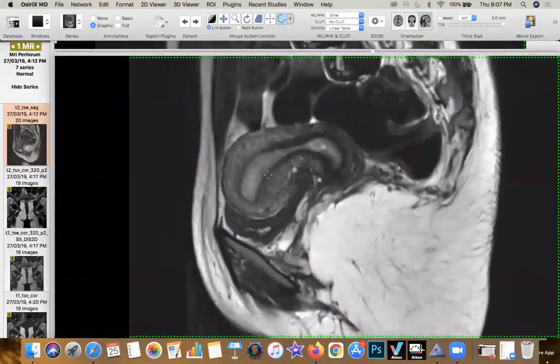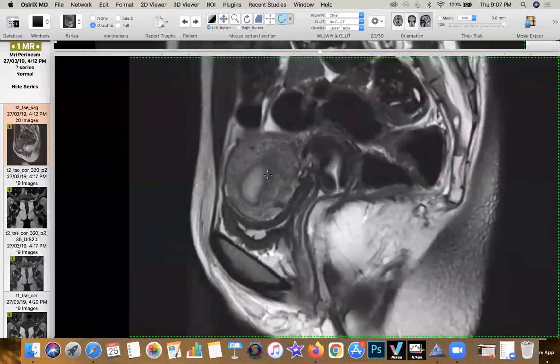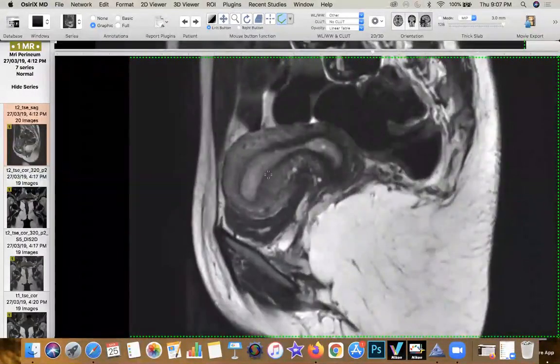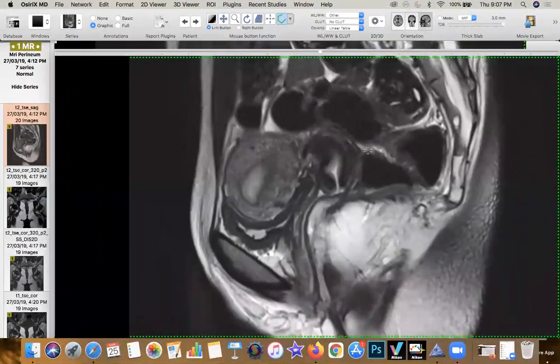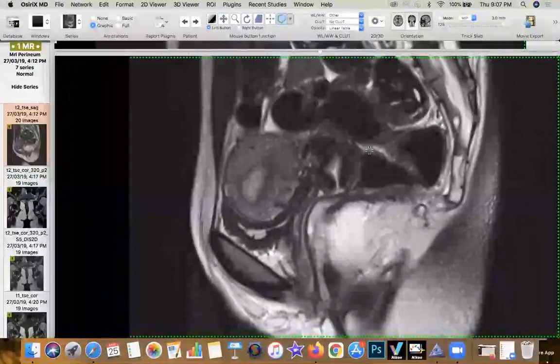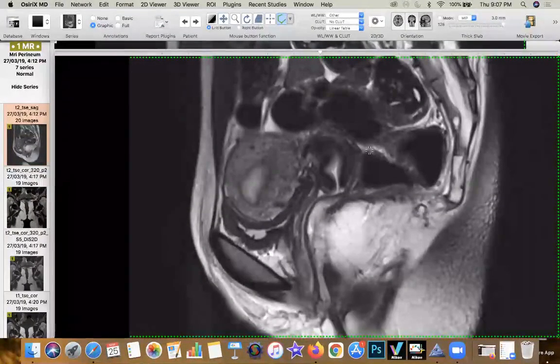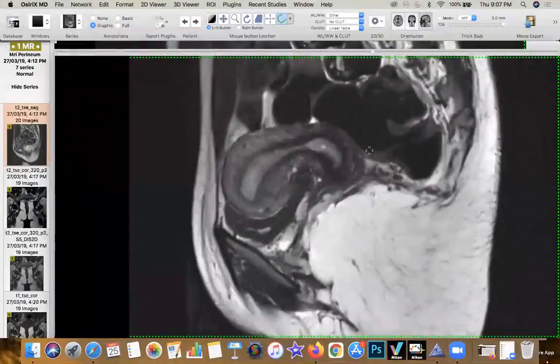Now, when you're looking at the corpus and you're dividing it into its peritoneal and subperitoneal compartments, you also need to identify a key structure similar to what you identify in rectal cancer imaging, and that exactly is the level of the peritoneal reflection in relation to the posterior lip of the cervix, and therefore the posterior fornix. Now, that's very difficult sometimes if all the pelvic loops are fecal loaded, or they're compacted into a very small space, but occasionally you're able to pick up that peritoneal reflection, like especially we have to do that in rectal cancer.